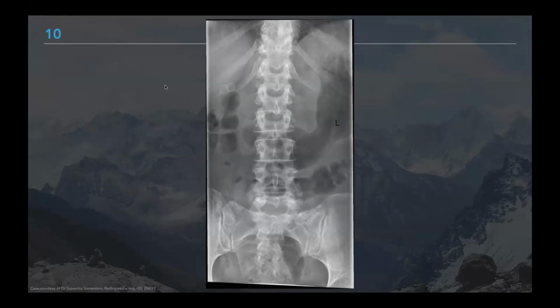Okay, so we've discussed renal calculi. Now we're moving on. Have a look at this. What would I say if I was in an exam? How would I go through this? Whatever structure you use, whether it be Abdo-X or something else, what am I going to say to the examiner?